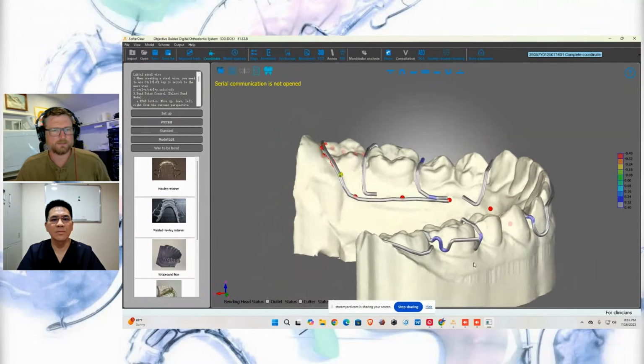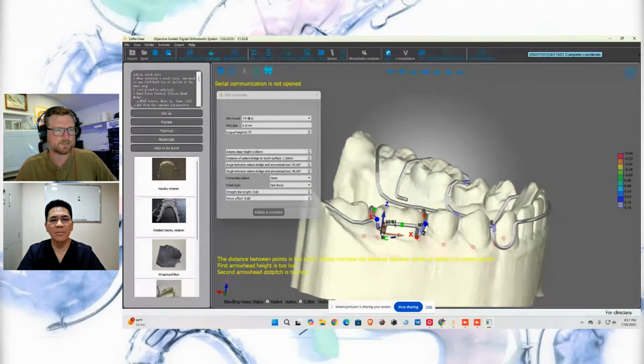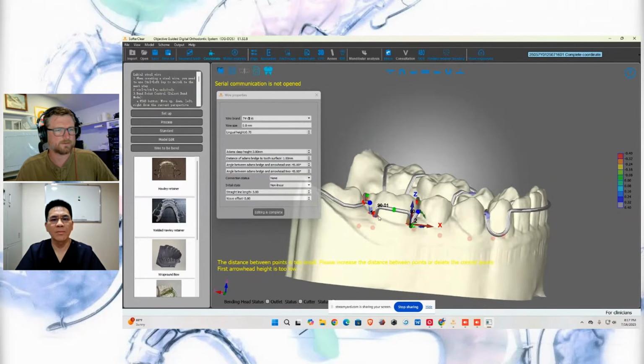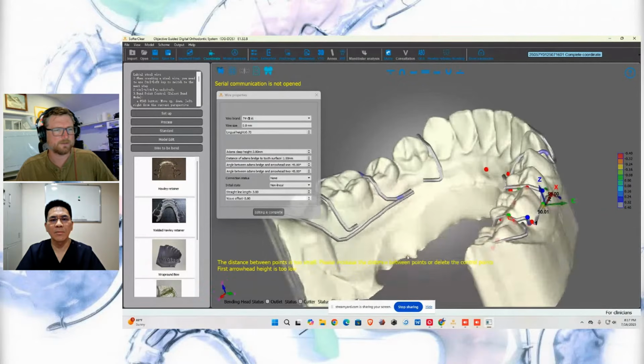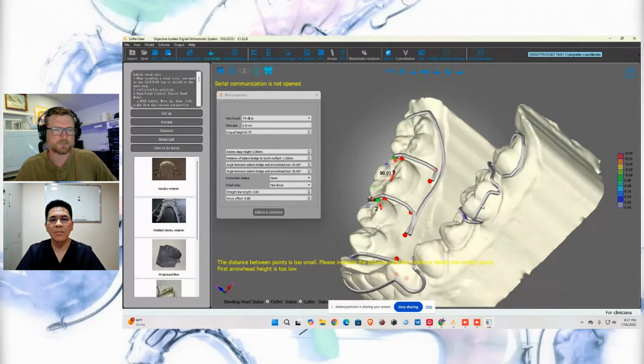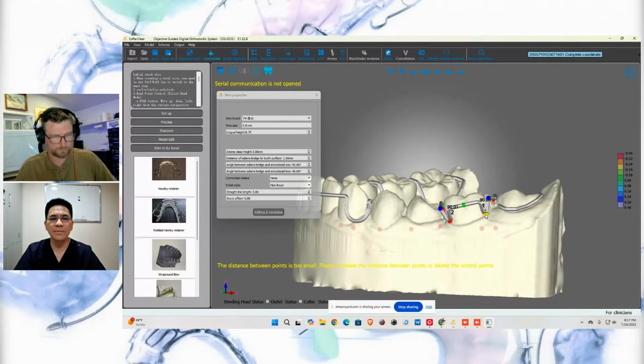But you can, well, I can move this into the gums a little bit. So you see it dove into the gums. So I'm going to click here and I put that there. Let me raise that back up. I like my Adams to be parallel. So let's look. And I'm doing this on purpose because there's a neat little feature that I want to show on the models.